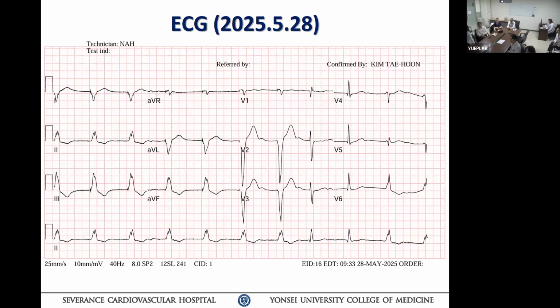Very low amplitude atrial activity, somewhat maybe regular, maybe not, but maybe more consistent with flutter, fib, things like that, right? So that proves that the atrium is not in standstill. There's atrial activity going on. Okay. Now you read the QRS complex as a left bundle, right?